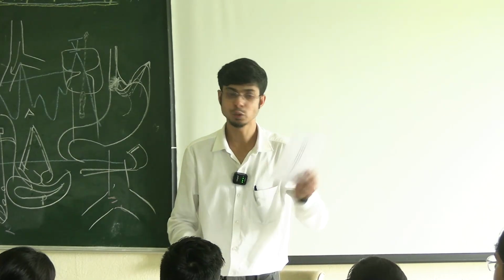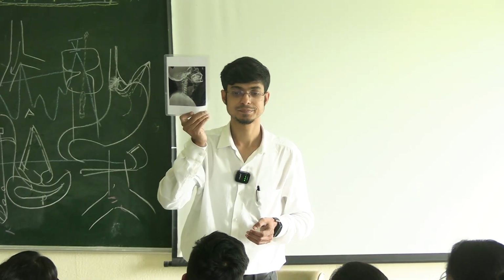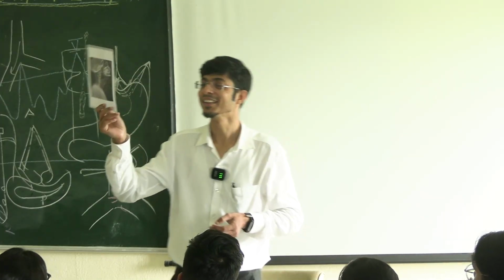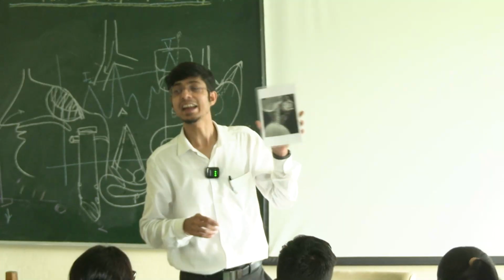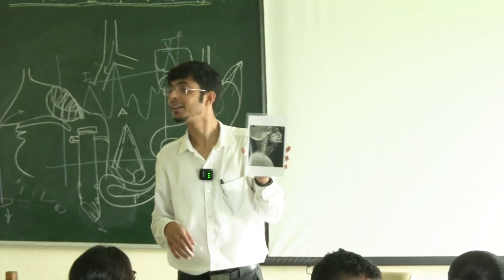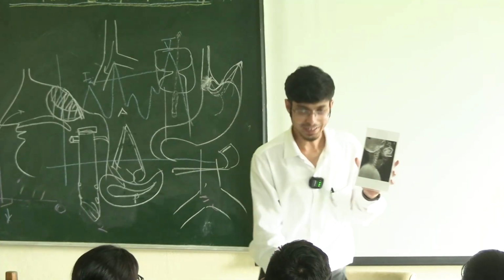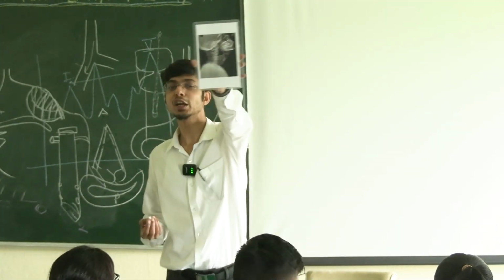Okay, one last X-ray we'll do today. What is this? Very good. So this is a very nice X-ray. Actually, you don't get such a good X-ray. It's a very nice X-ray. It's a classical retropharyngeal abscess showing air fluid levels.